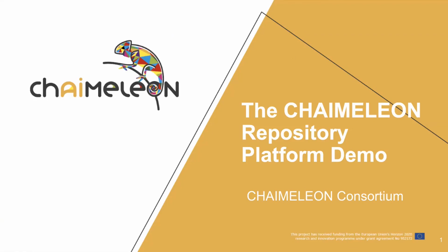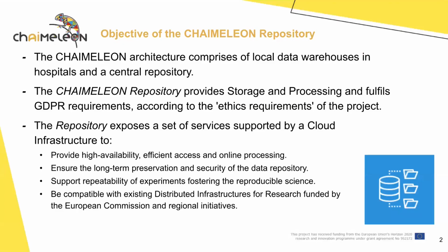Welcome to this demonstration of the CHAIMELEON repository platform. First, let me introduce that the CHAIMELEON architecture comprises local data warehouses in hospitals and a central repository. This central repository provides storage and processing and fulfills GDPR requirements according to the ethics requirements of the project.